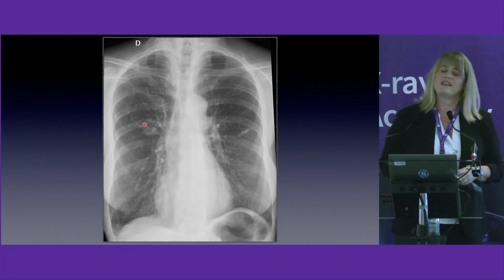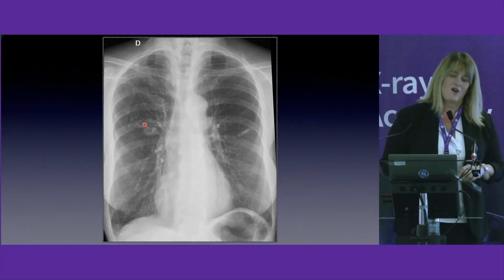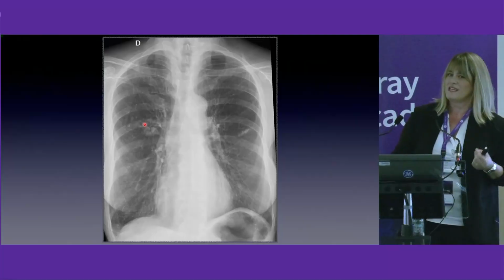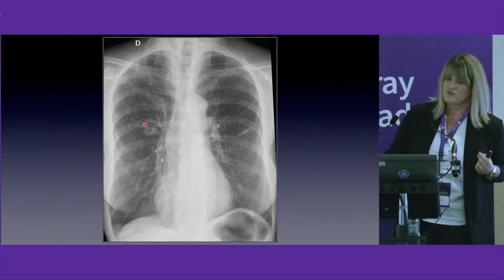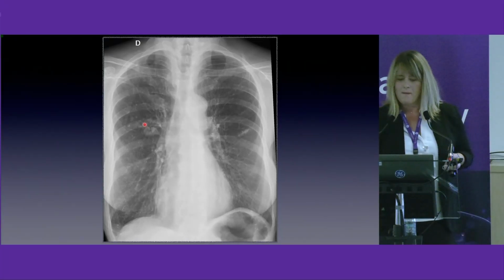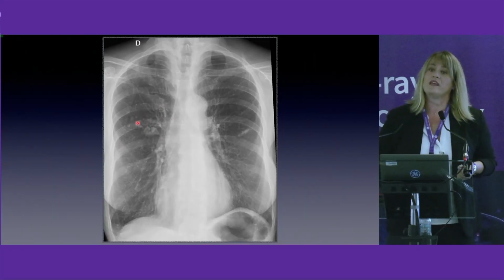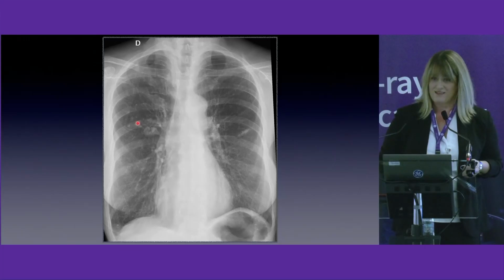we are quite familiar with exposure to asbestos, so we assume that those kinds of alterations are related to previous asbestos exposure. But we don't know if just beneath this pleural plaque there is something else.